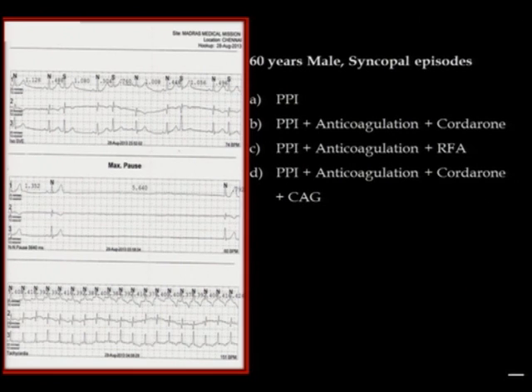Or, it is good to do as much as possible because you care so much for your patients. Why not do everything, including an angiogram and Cordarone? Well, which is inappropriate. What I think the best thing to do in this patient is to look at a permanent pacemaker implantation anyway, because nothing less than a permanent pacemaker is going to obviate the need for prevention of syncope because of the pause.